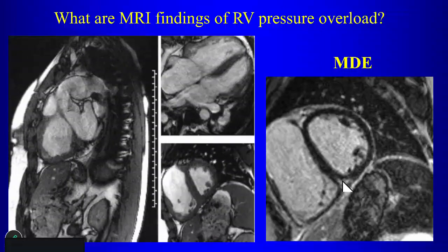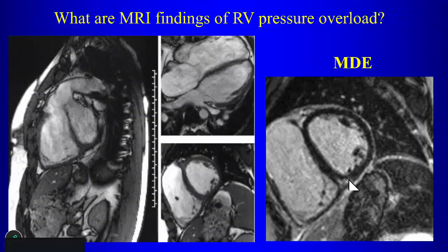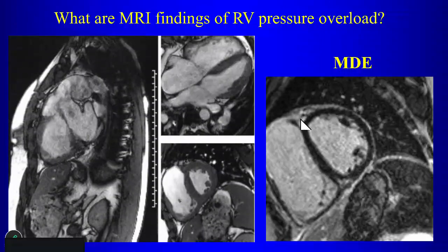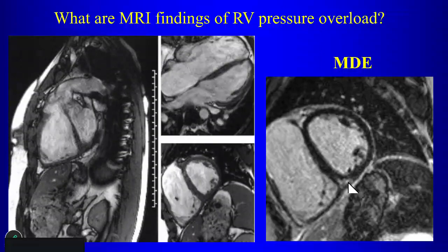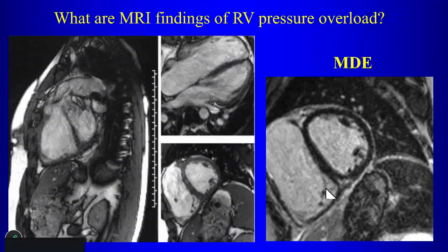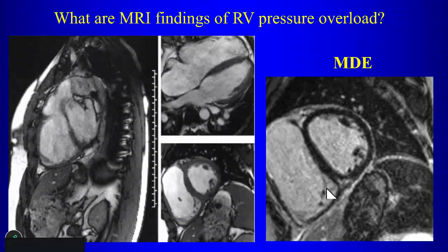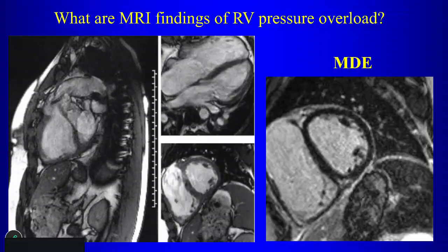It's right here at the hinge points. So at the insertion of the right ventricle on the interventricular septum, you apparently get this added strain, and you'll develop a little bit of fibrosis there, and you get these areas of abnormal enhancement. There's another disease that also gives you enhancement at the hinge points, although it looks completely different than this in terms of the other characteristics. What disease also gives you enhancement at the hinge points?